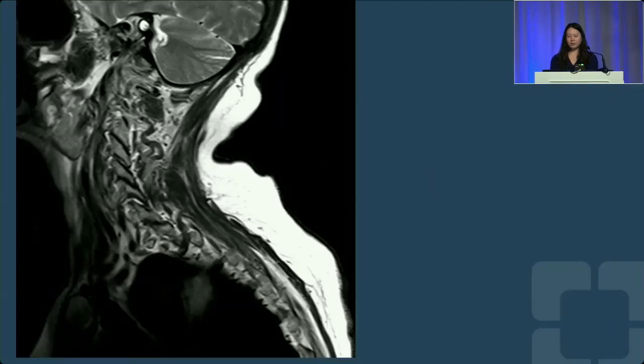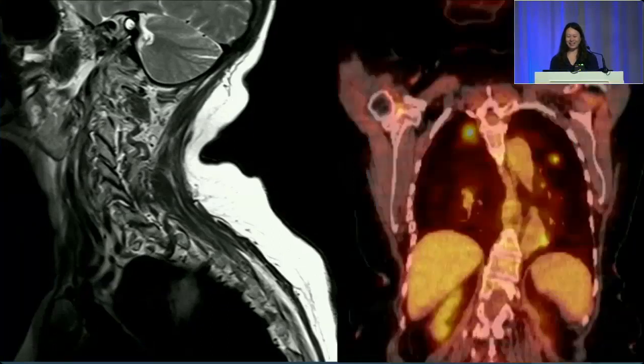Other things that we're responsible for as a radiologist is not necessarily just the spine. We have to look at everything outside of it too. So that's why it takes us more than like a few seconds to look at the spine. It takes us a lot of time. Because why? Here's an example.